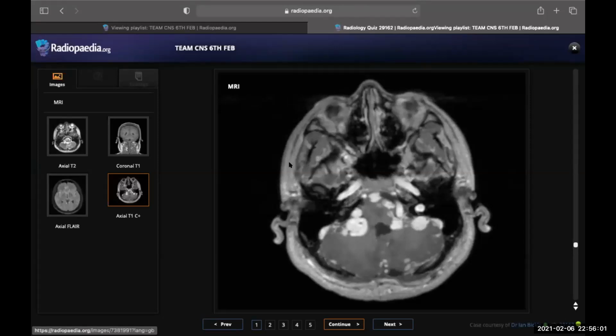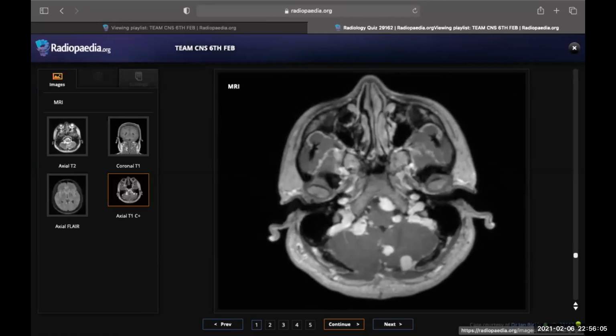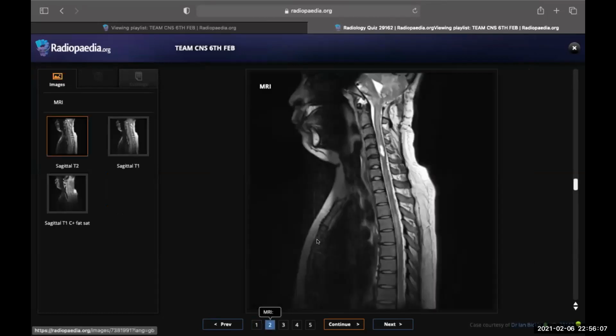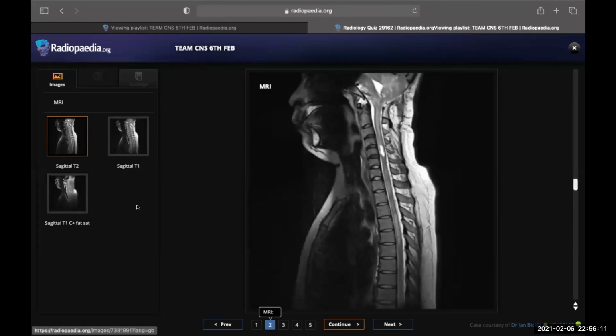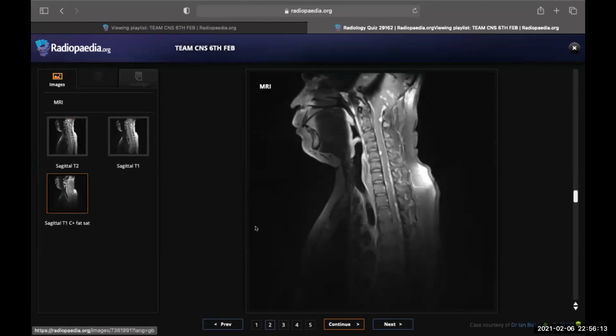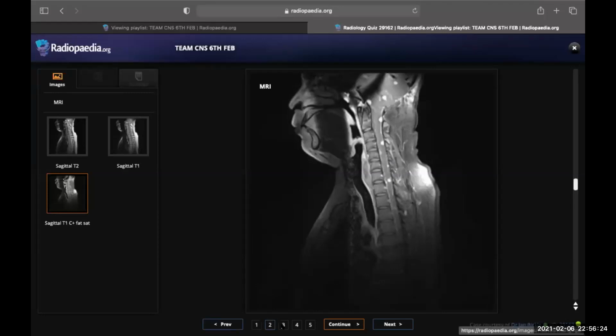No, before the ultrasound, the patient is in MRI. Yeah, I will do MRI spine, extend to the whole spine. Excellent. We'll rush through this case, huh? So what do you see on the spine? Just the main findings. So there are small lesions lining the whole spine, which are drop mets. It's called drop mets and it has another name, I don't remember. So these are spinal hemangioblastomas.